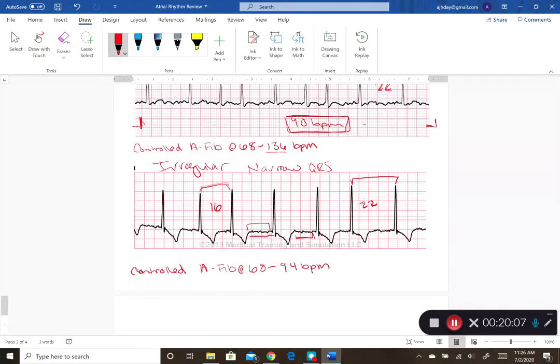And then do I have any ectopy here? So here's my J point. So my J point ends on that isoelectric line, but you can see my T wave is inverted because we go from that J point, which is maybe a block below, but not enough to call it ST depression, and my T wave is upside down. So we need to note that.